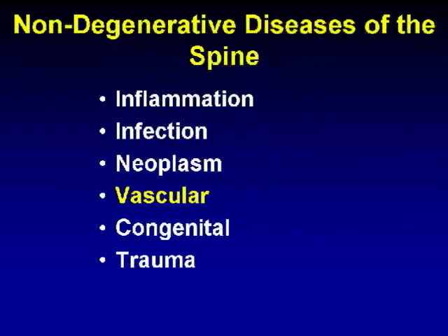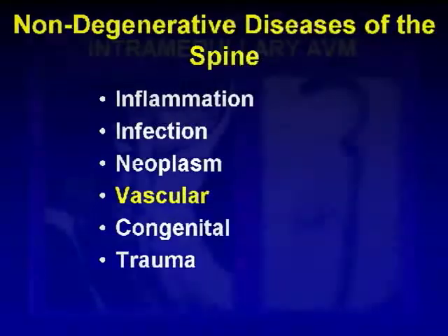Now, the next few categories you're less likely to see on exams, but it's important to know a little bit about them. Spinal AVMs. I'm sure if you see one on the boards, it means you've passed. If you just consider them like tumors, abnormal tissue, either they're in the spinal cord, intramedullary, in which case they're congenital, you were born with them, they're dangerous because they bleed, like a brain AVM, they're in young people, or they're outside the cord in the dura, or pia, which is usually a spinal dural fistula. Those are older patients, and they're acquired. And I'll show you an example of each.